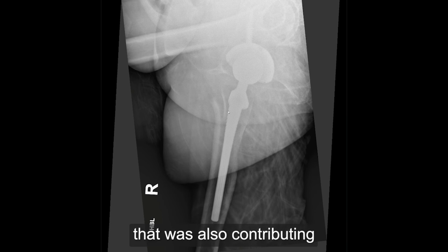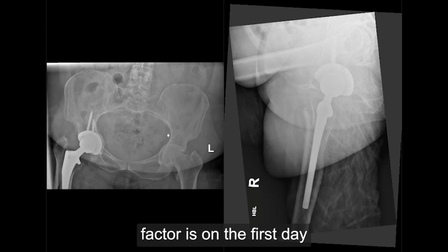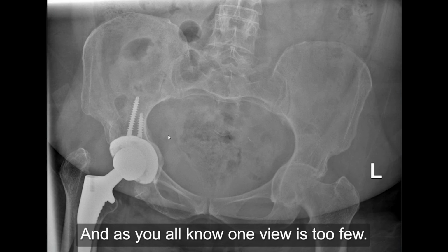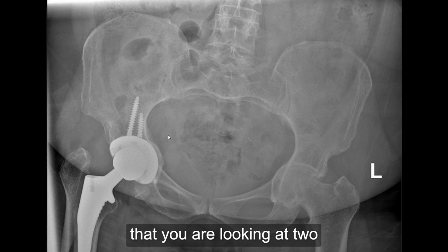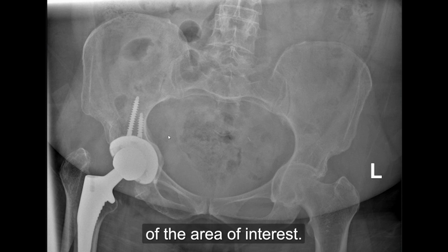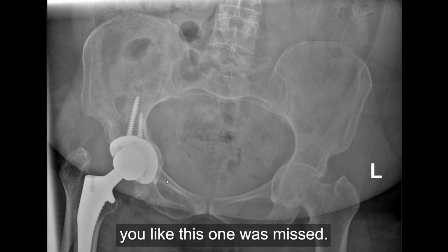The other mistake that was also a contributing factor is that on the first day, only one AP radiograph was obtained. And as you all know, one view is too few. So you should make sure that you are looking at two orthogonal or two different views of the same patient of the area of interest. Otherwise, you miss a pathology like this one was missed.